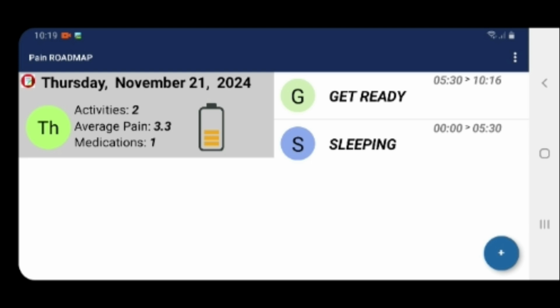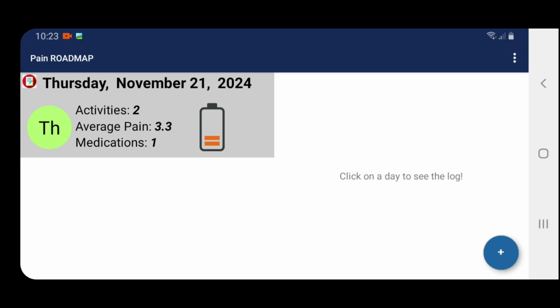The battery here relates to how much of the activity data you have put in. We would ideally like as much of the day accounted for as possible. If I am missing daily activities for certain times, I just assume that you aren't really doing anything and you are resting during those times. So we do want as much of the day filled out as possible. This battery will go up the more data you have, and we would ideally like it to be an aqua color.